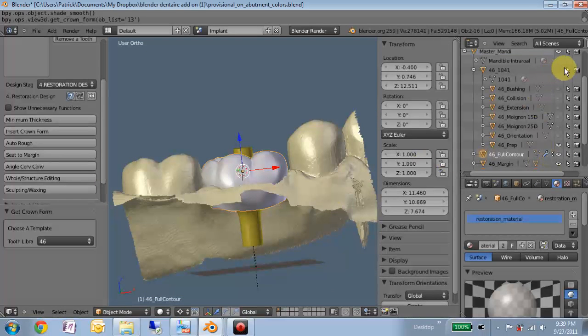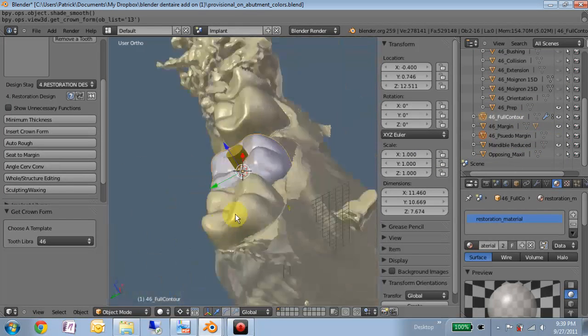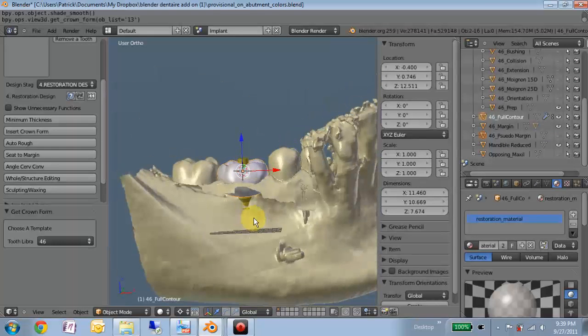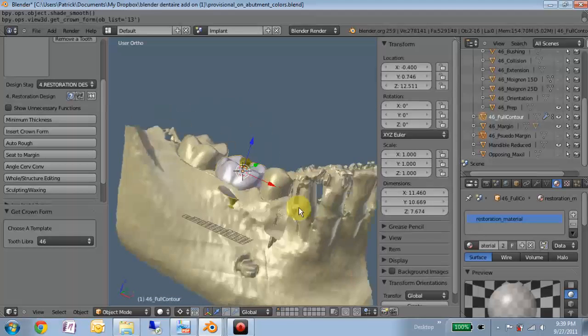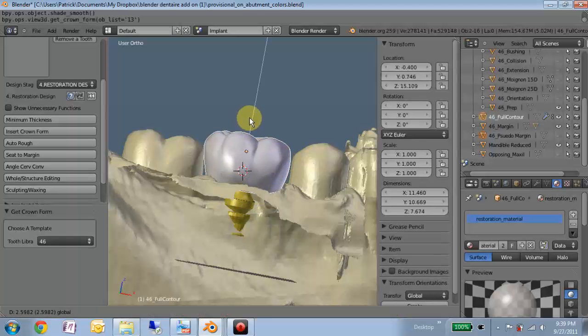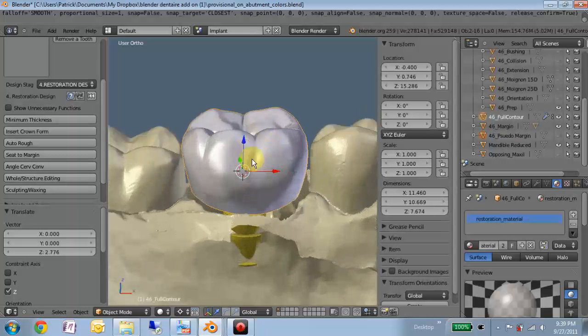Alright, so now that we've done that, we can see that everything is still as it should be. The abutment's there, in the same spot in the mandible. It's harmonious with the dentition. The only thing is this abutment is really tall, so we'll just ignore that this is going to be incredibly hyper-occluded.